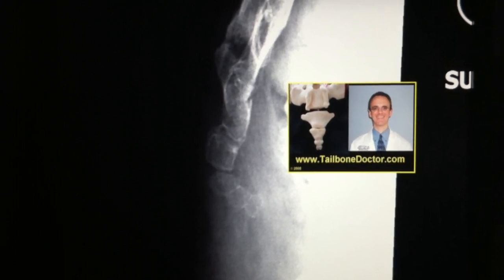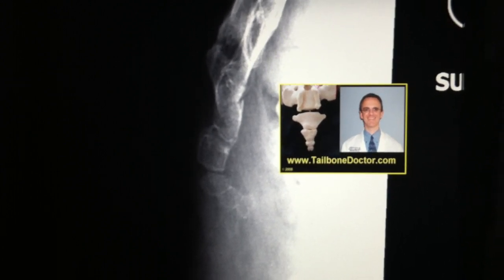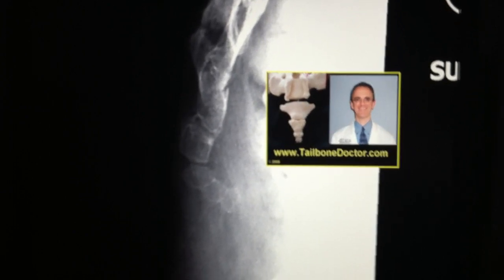This is a video just showing the x-rays of a patient with a tailbone fracture. So a fracture or broken bone at the coccyx or tailbone.